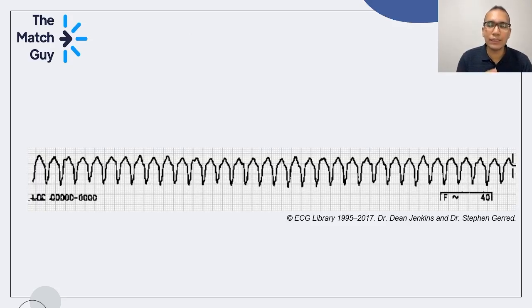Okay, now let's look at something that's more serious. Take a look at this ECG and tell me what do you see. And go ahead and pause the video if you still need more time to think about it. But I'm talking again in 1, 2, 3.